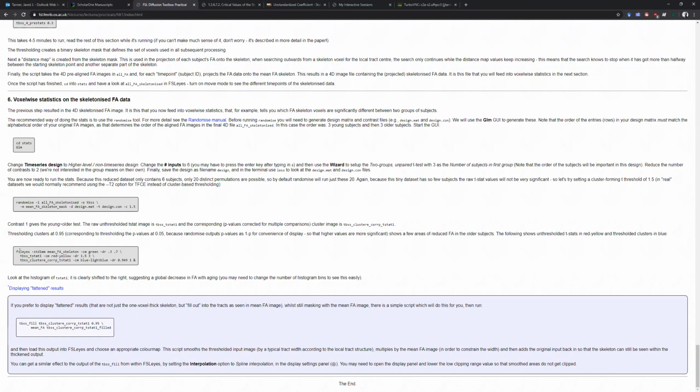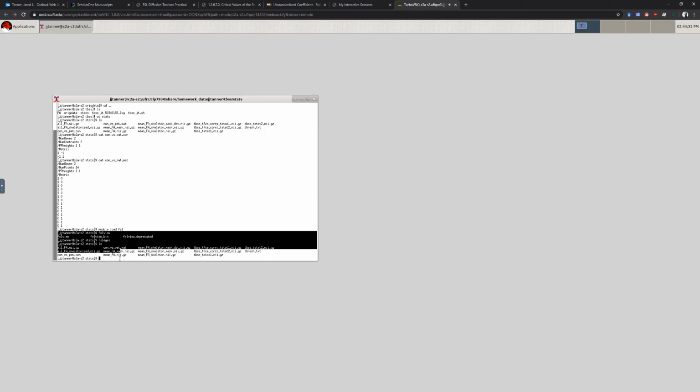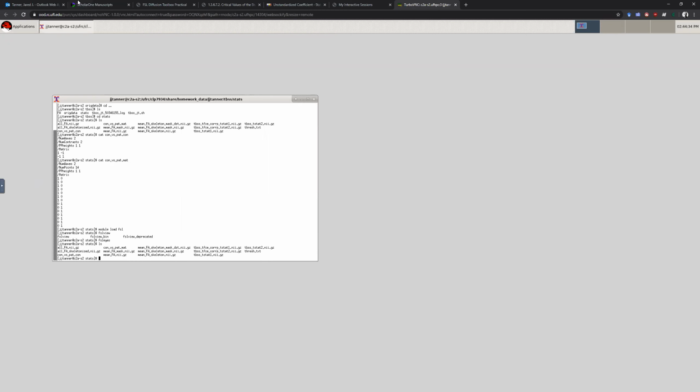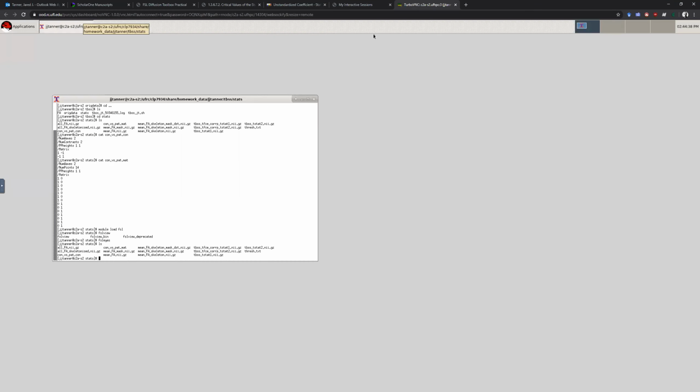And so most of this we can copy. I'm going to copy that first line. If we have those lines in there, it would copy it and be okay. Oops, I had that highlighted, so copy that.